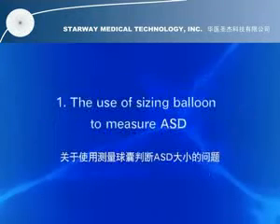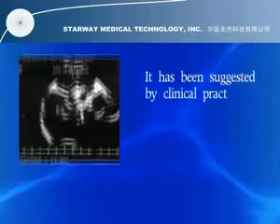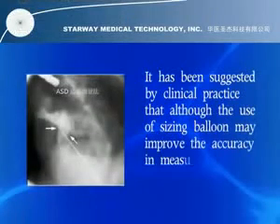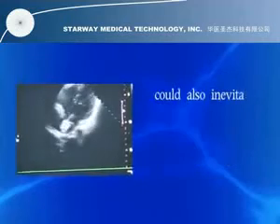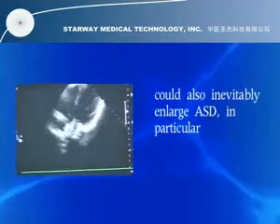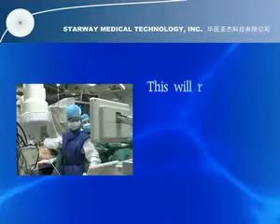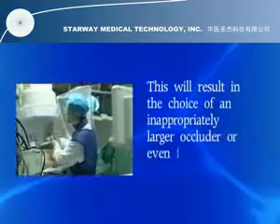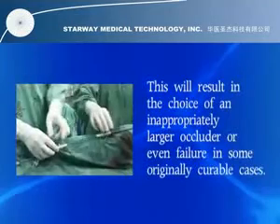Questions to be concerned. The use of sizing balloons to measure ASD. It has been suggested by clinical practice that although the use of sizing balloons may improve the accuracy in measuring ASD diameter, it could also inevitably enlarge the ASD, in particular the type with floppy rims. This will result in the choice of an inappropriately larger occluder or even failure in some originally curable cases.